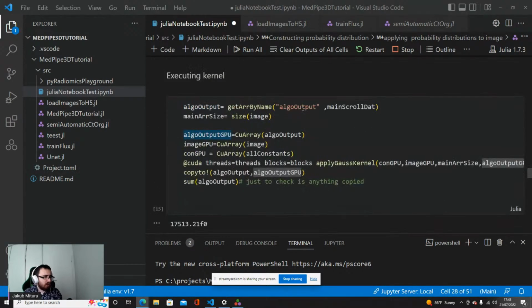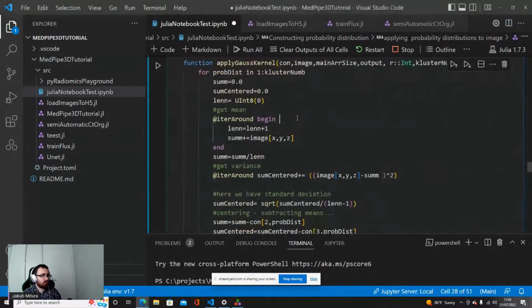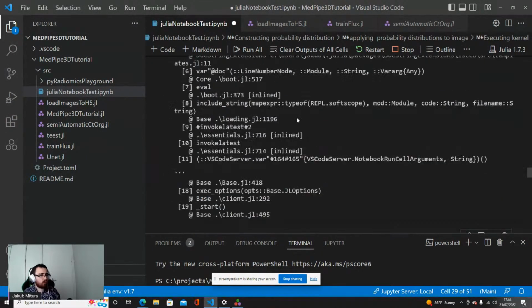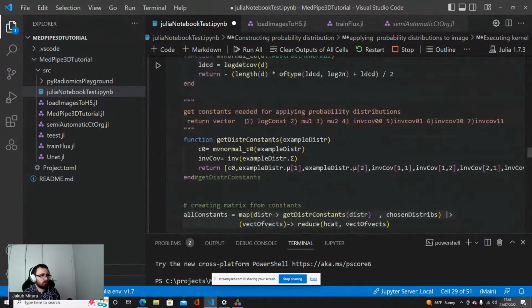So now we have this. Wait a moment, I did not execute this. No, I did not execute this one also.